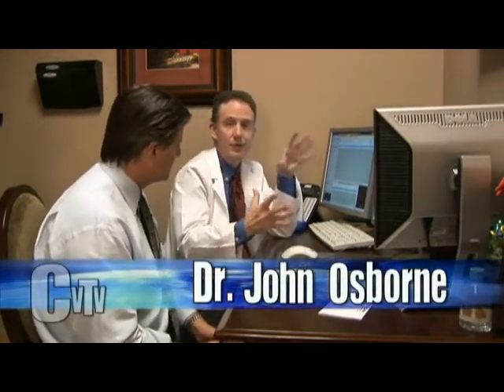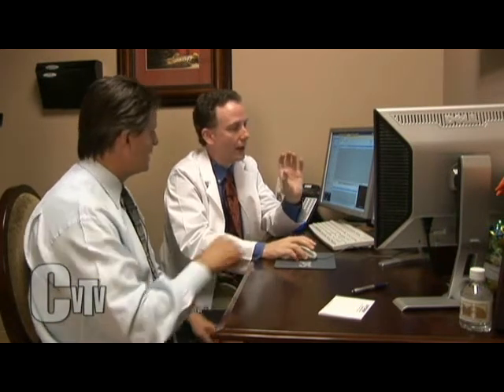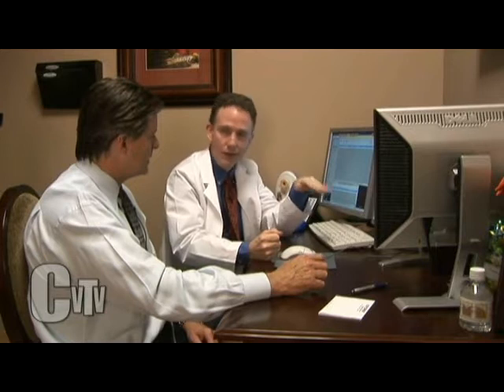When we take these images, we take about 3,000 slices in about 10 seconds. So it's a very rapid fire, high speed CAT scanner. And with this, it allows us to take this data and, as I tell my patients, it's kind of a virtual autopsy. So let me take you through that right now.